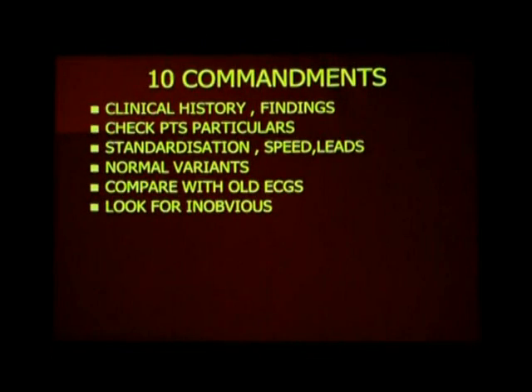All the fellows will diagnose an inferior myocardial infarction, but I must diagnose a posterior myocardial infarction. I must diagnose a right ventricular myocardial infarction. I must diagnose an atrial myocardial infarction. I must diagnose an associated AV block. So all these things are inobvious. Obvious is inferior infarction. Everybody will diagnose inferior infarction.